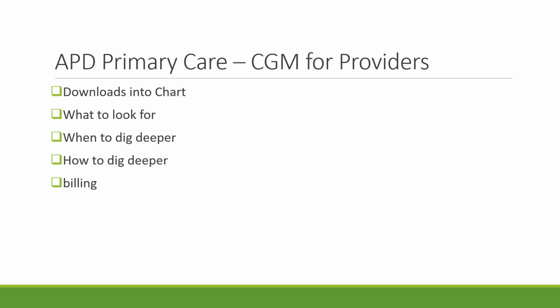This is just a very quick review for providers so that you have a good understanding of the data that's being copied into your notes for patients with continuous glucose monitors, and also to have a sense of what to look for in those reports, when it might be a good idea to dig deeper than those reports, and how to dig deeper. And then we will do, for the 100th time, how to bill for this service.